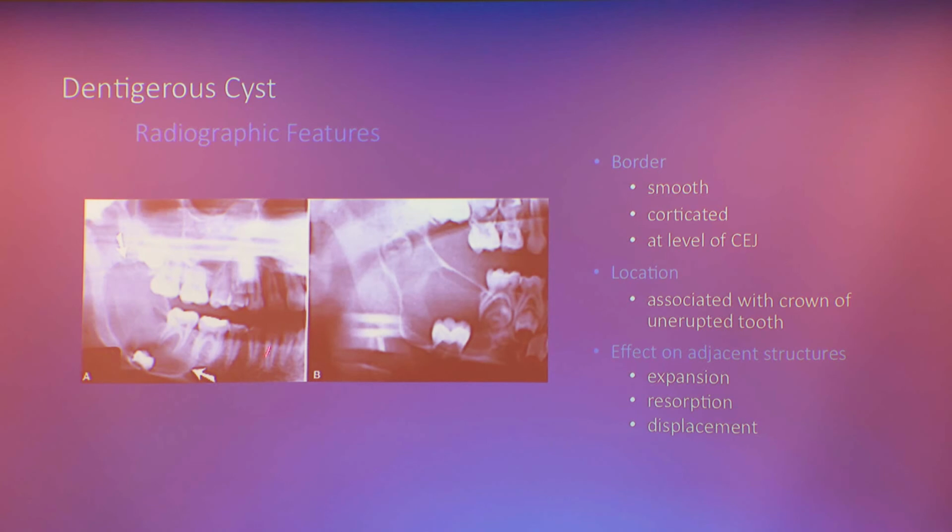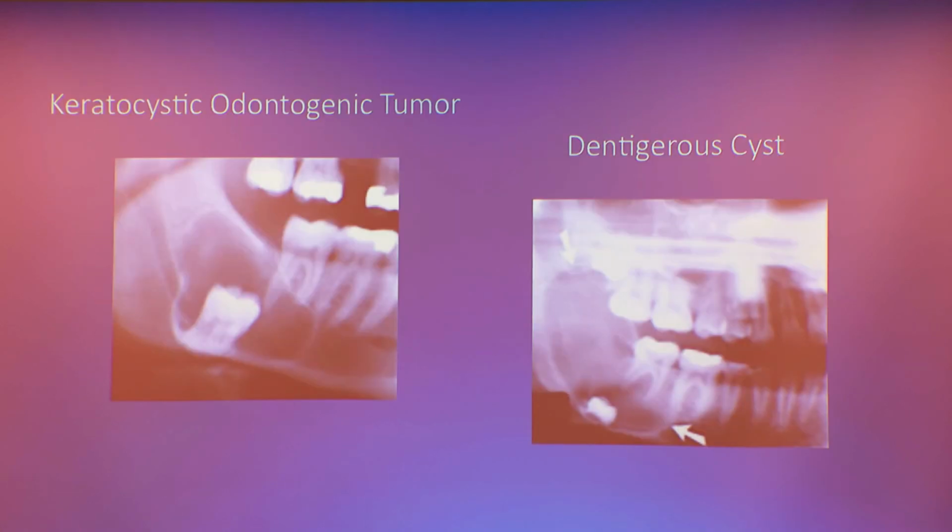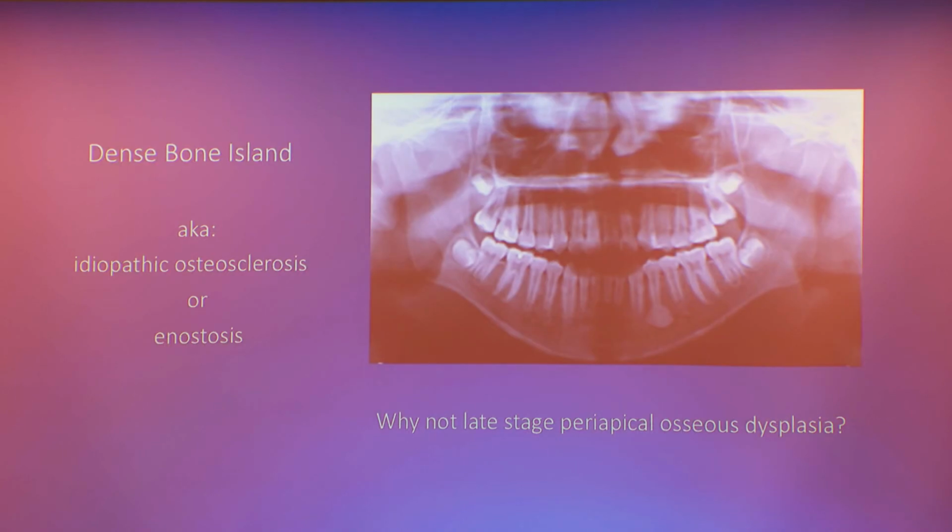That's the main thing. Anytime you see an unerupted tooth, consider dentigerous cyst. Look at the follicle, the follicular space. If the distance from the enamel of the unerupted crown to the wall of the follicle is more than 3-4 millimeters, then we want to consider it dentigerous cyst. They expand a lot. You can see it pushing the crestal bone up here, displacing teeth, resorbing roots, all of those things. Again, just more conditions you can review on your own. All right.